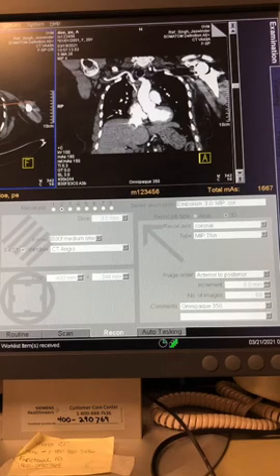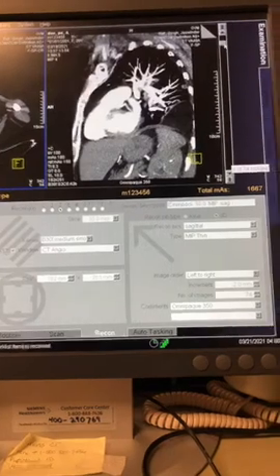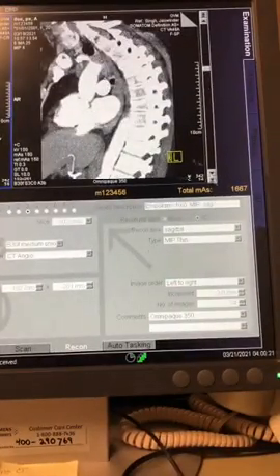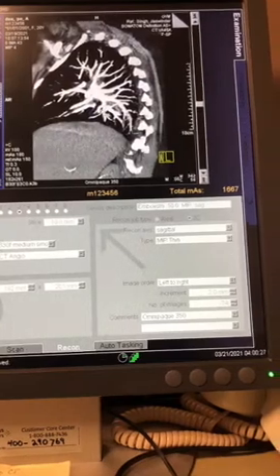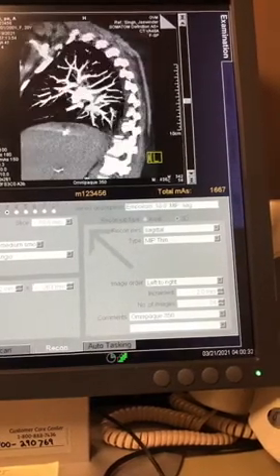There we go. There's our recon. Let's see if we can put that vessel on end. All right, so we're in the heart here. As we come out, here's our pulmonary trunk facing us, so it's right on end. Look at that. We're looking down the lens of that entire pulmonary tree.